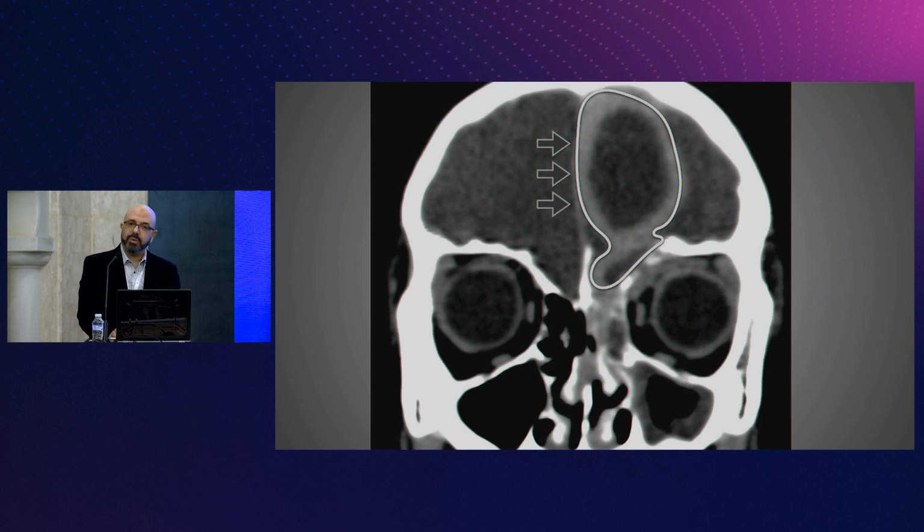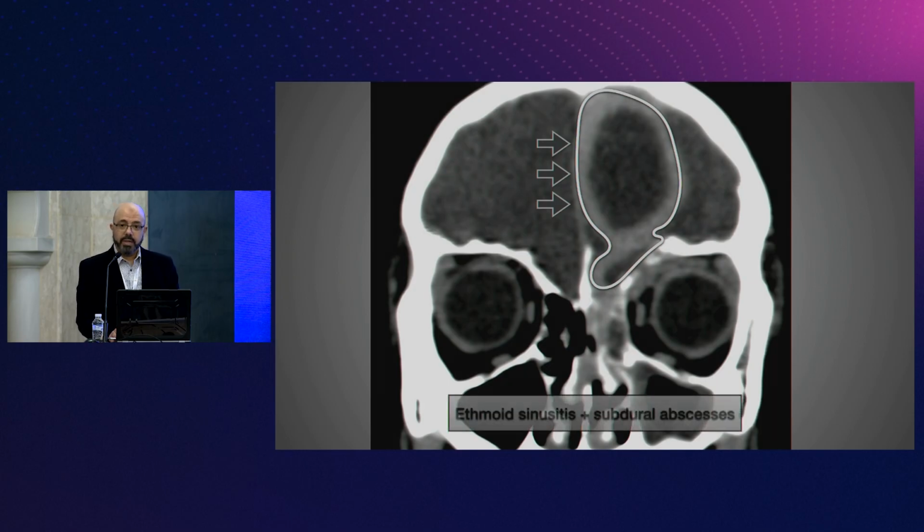Is it really important to differentiate on our report, is it subdural or epidural? It is, because if the pus is in the epidural space, the surgeons will just have to open the calvarium and they will find the good stuff oozing out, right? If it is subdural, they will have to open up the calvarium and the dura to find their treasure.